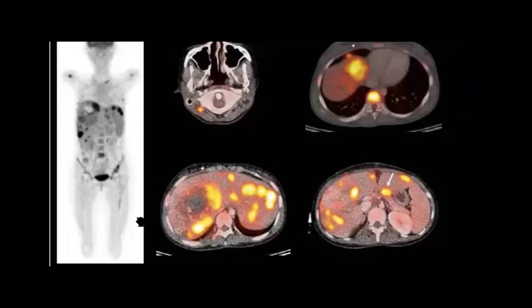So there are bone lesions and there are liver lesions. Yeah, nice. And there is a subcutaneous lesion. You can consider it as a nodal lesion. And look at this one. Maybe it is outside the liver. So if it is outside the liver, where do you consider it?